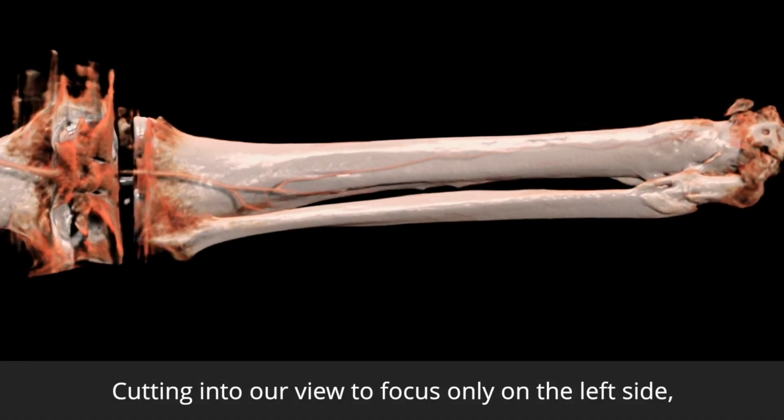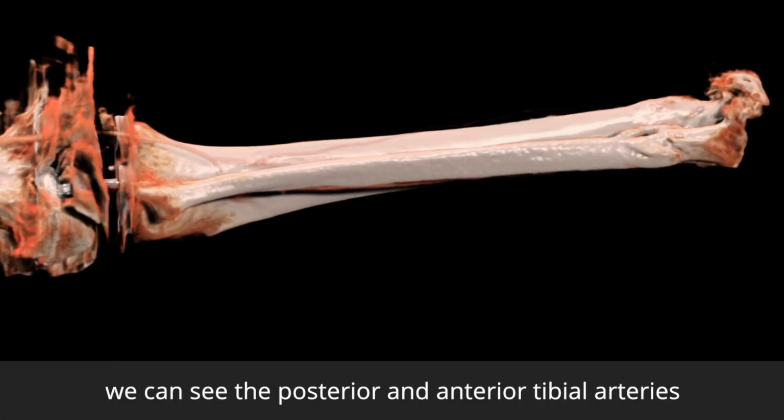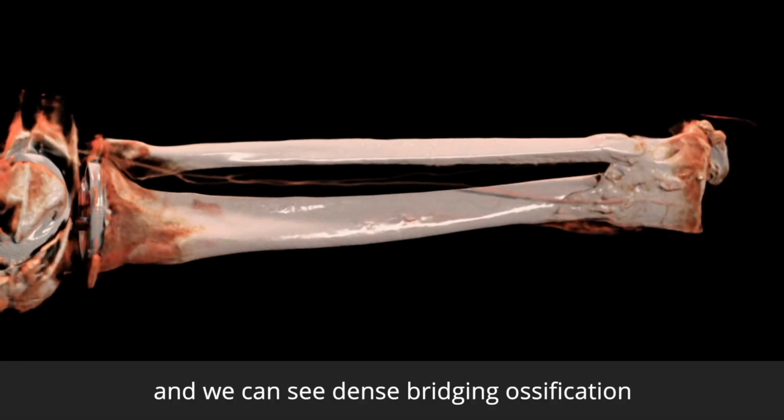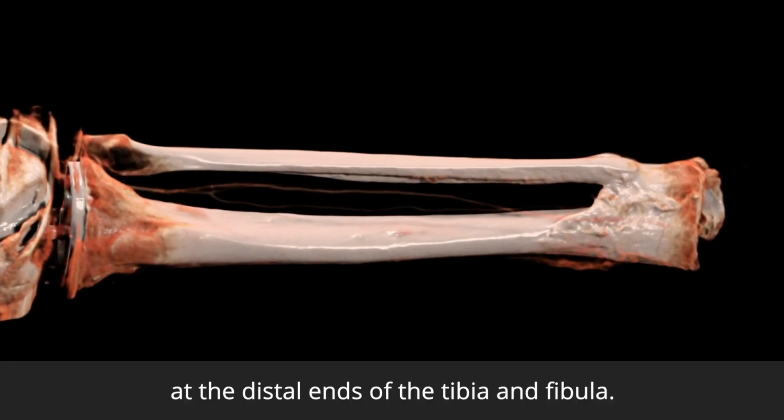Cutting into our view to focus only on the left side, we can see the posterior and anterior tibial arteries running into the distal stump, and we can see dense bridging ossification at the distal ends of the tibia and fibula.